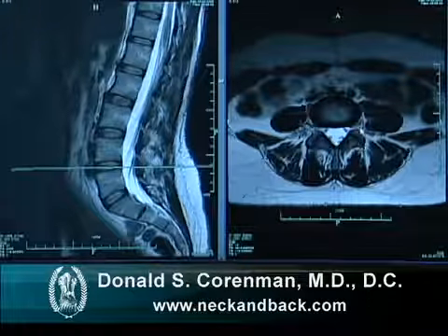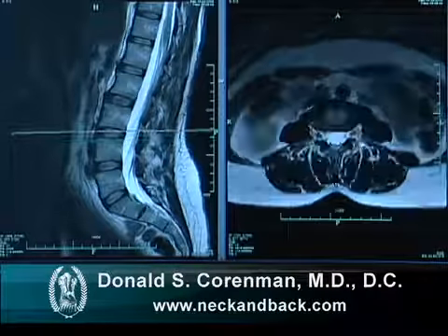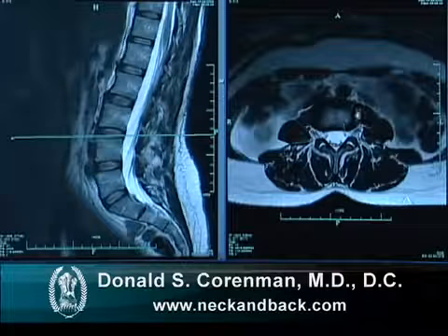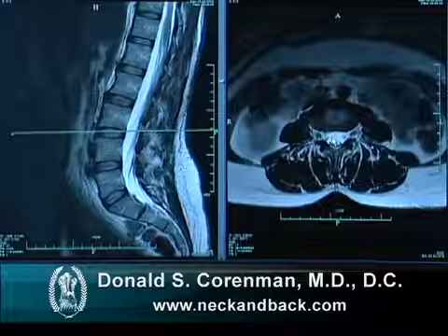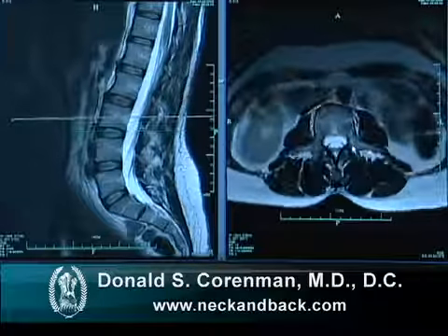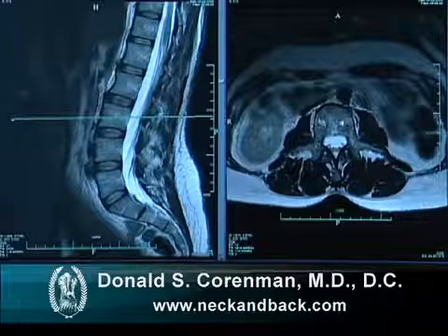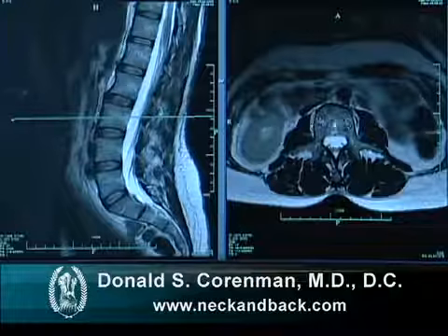These are normal facets. We can march up then and go to the next level at 3-4 and again see the same thing: the jelly-filled donut, the outer plies of the tire, the sac of nerves. If we get a little higher, we can see the actual facet joints, and this is a normal level. We can continue to go up and see more. Here is the basivertebral vein and some of the veins within the vertebral body itself. So when you look at these images, these are normal.